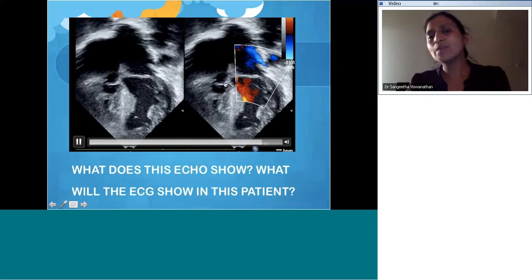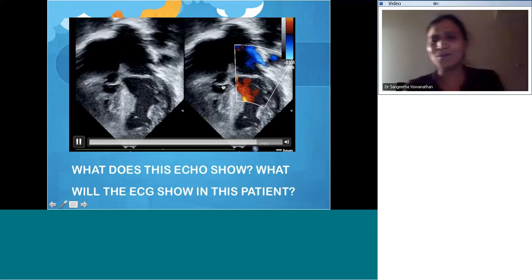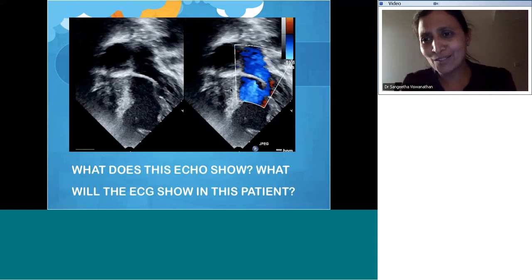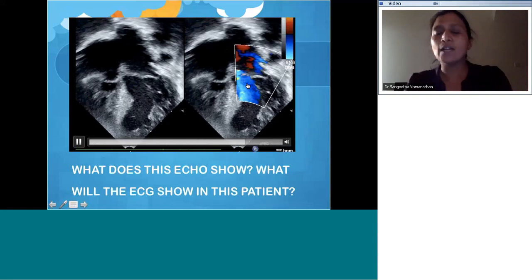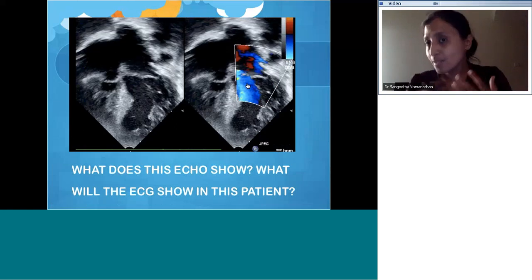So here the tricuspid valve is very small. Okay, I'm getting many answers. Hold on, not the right answer though. Finally, the right answer. Okay, so if you look at the right ventricle, first of all, you would think of an RV to PA conduit, etc. if you think that the right ventricle is salvageable.